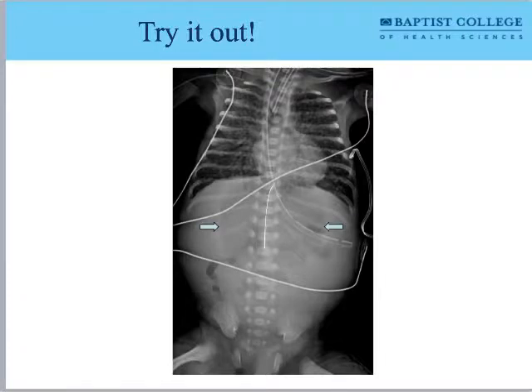So first, we'll look at the bowels, and right off the bat, there's something going on with the bowels. I can't see clearly through all of the intestines. Again, psoas muscles not readily apparent, but is it feces? Is it something else that's going on? Bones, clearly, as I'm looking at the bones of this, is a very young patient, a neonate, which is why we're doing chest, abdomen, pelvis on them, pretty common. And that's also revealed in the artifacts. There's some kind of NG tube or there's leads, there's all sorts of artifacts on the image.